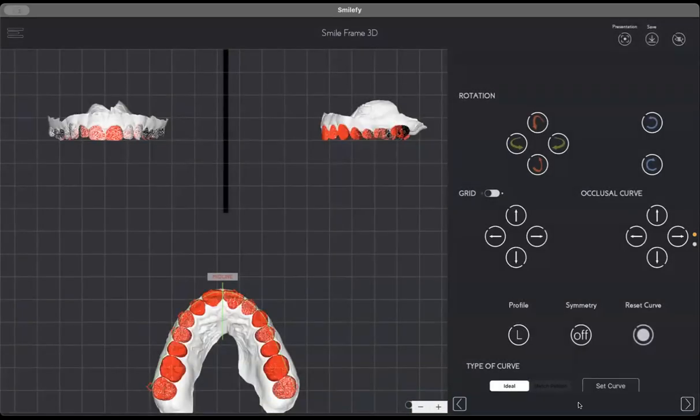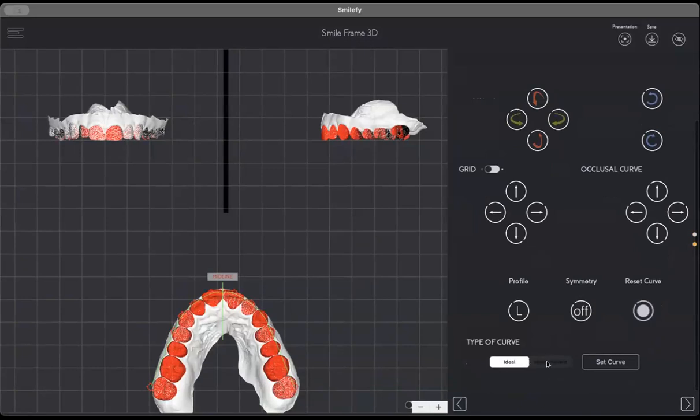the intraoral analysis, as you can see, creates an occlusal curve. The occlusal curve, you can set to ideal or following the patient's arch. Ideal, the curve is symmetric. Following the patient's arch could be, of course, not symmetric. You can have the occlusal curve calculated automatically. As you can see, the frontal profile and occlusal view are calculated automatically. So everything that we do manually now is automated.